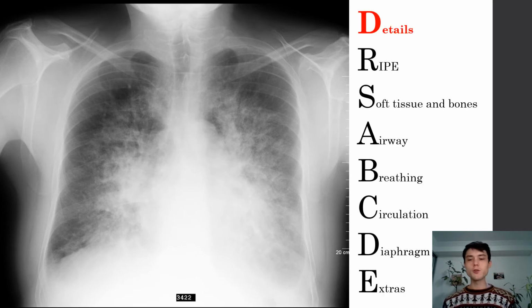So I thought it would be useful just once to go through Doctor's ABCDE for a chest x-ray with pathology, and then in subsequent x-rays, I'll go through them much more quickly. So I've already commented on the details of the 60-year-old man who presents with shortness of breath.